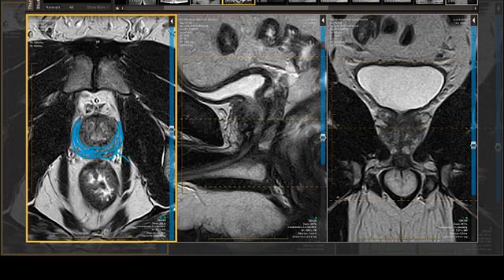PZA, PZP, PZM. And central region of the prostate. And there's a little bit more of our lentiform anterior fibromuscular stroma. Comes a little bit more off to the left side. So everything that is uncolored is central region of the prostate. It's not unusual to not be able to see the urethra, which is going to make an angled turn for the anterior. So it's probably right there, and the tissue behind it is the verumontanum.